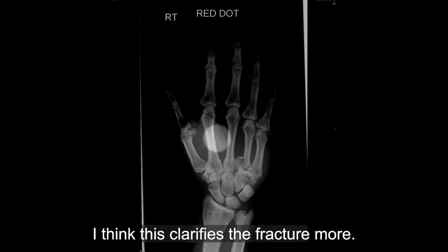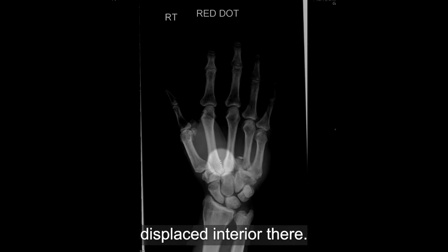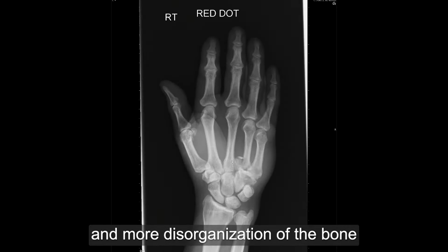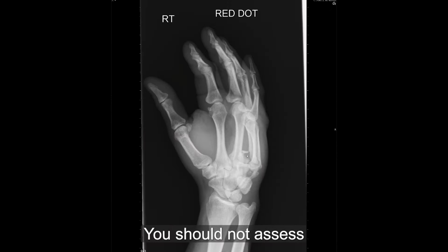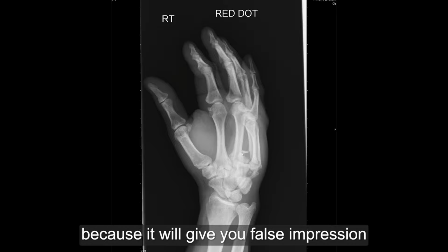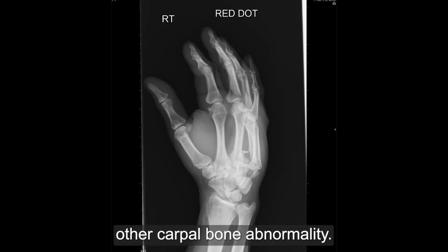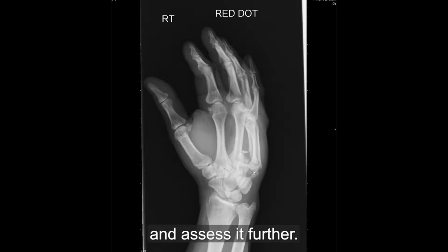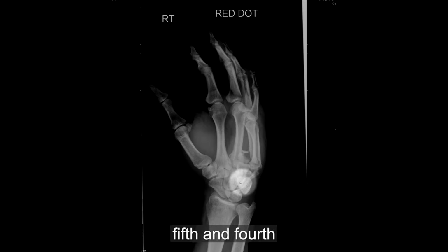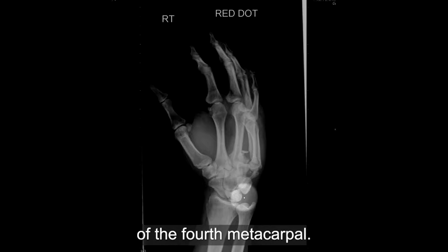When we look at the lateral radiograph, I think this clarifies the fracture more. You can see a fragment displaced anteriorly here, another fragment displaced anteriorly there, and you can see more fragmentation and more disorganization of the bone at the fifth carpo-metacarpal, where you can see the dislocation. You should not assess other bones on this view because it will give you a false impression that there is other carpal bone abnormality. You just look at the initial abnormality you saw on the AP radiograph and assess it further. So now we know there's established fifth and fourth carpo-metacarpal dislocation with fracture of the base of the fourth metacarpal.